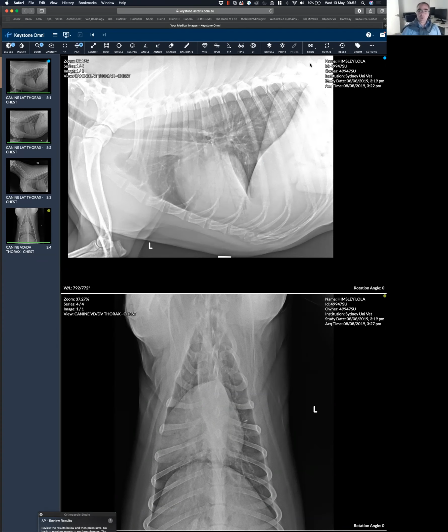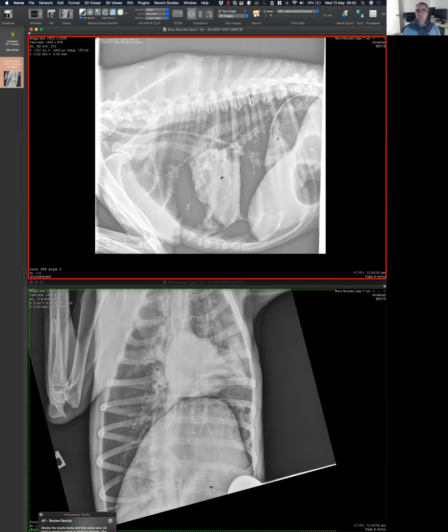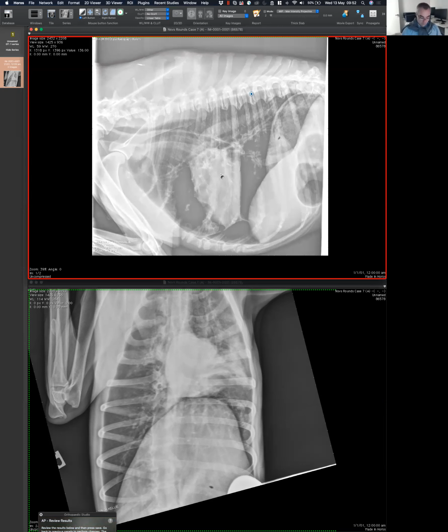So if we come back to the other case, it's not only one reason why we don't see these lung changes. The reason is probably both. First, we are overexposing. Second, it's the wrong lateral. So I would trust those changes, and I would say, in order for me to document those better, I need to take the other projection and correct the exposure. Okay. Any questions? I think we kind of cleared everything.